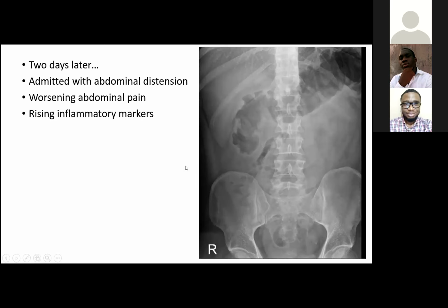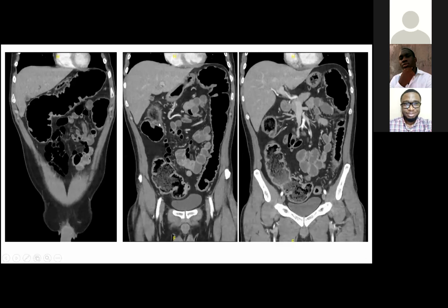And when you compare this examination here with the first one, you can see now that there is more pronounced distension. So not just the edema now; in addition to the edema thumbprinting, there's no fecal residue, and there's distension of the transverse colon. So toxic megacolon is not a diagnosis you make on X-ray alone. It's a combination of X-ray and clinical features as well. And so I think the thinking in this guy, given the clinical deterioration and the X-ray findings, was that he was developing toxic megacolon. He actually also had a CT scan on the same day as that abdominal X-ray.